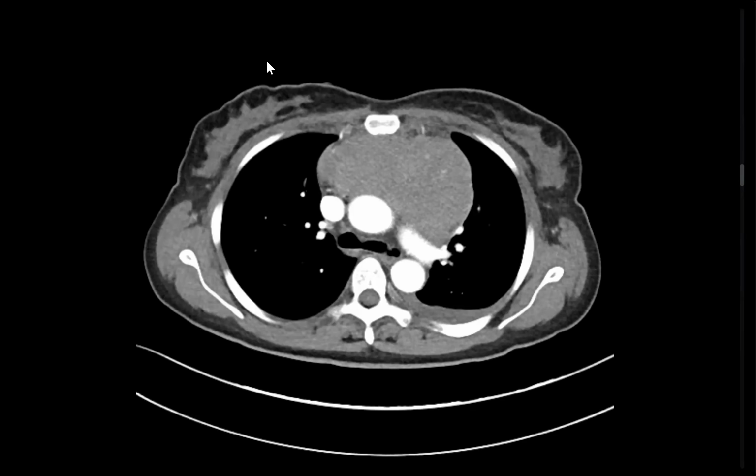Name the pathology if calcified soft tissue mass in the anterior mediastinum related to histoplasmosis. Good. Fibrosing mediastinitis. Yes, good. Fibrosing mediastinitis.